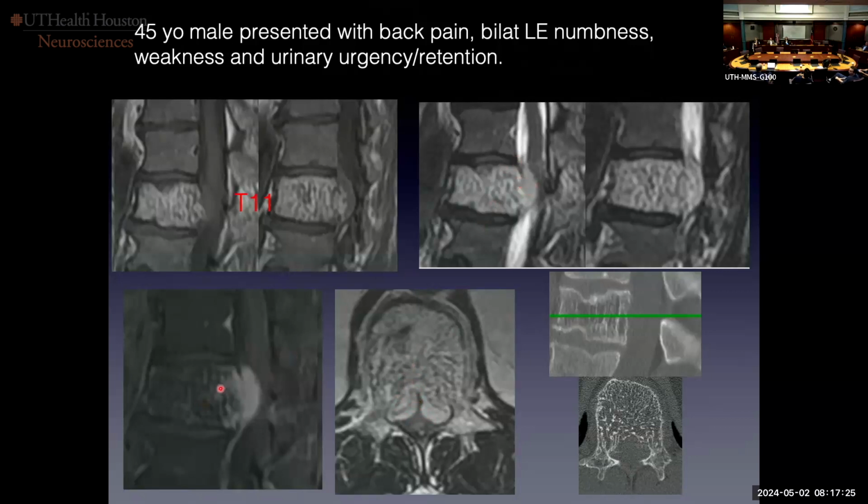Notice on the fat suppressed image how most of this hemangioma, because it's fat, is suppressing, but the angiomatous component, it has very little fat, it's lipid poor, is enhancing very densely. And I think that's the other thing that's causing that difference in appearance. Some people have said, I think Nick Theodore said in his article, that he sees the hemangiomas that have more vascular spaces do this more often.